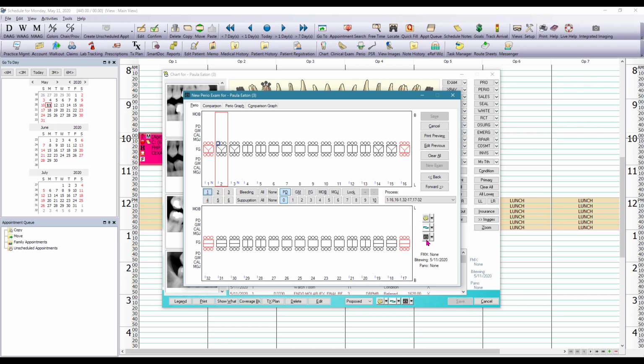If you click on the drop down under process, there are other paths already created in there, but you will have to make sure that you change the process every single time before you get started charting. If you don't want to follow the computer's path, you can manually click on each dot, which represents a pocket. But this way you can chart continuously.